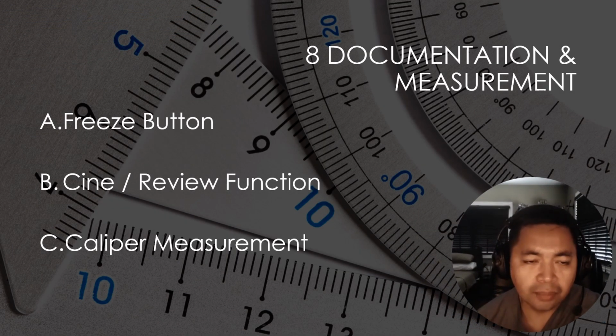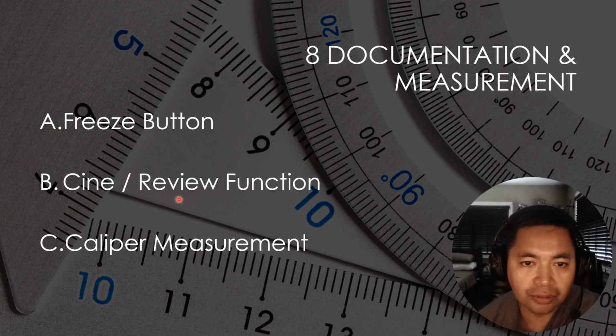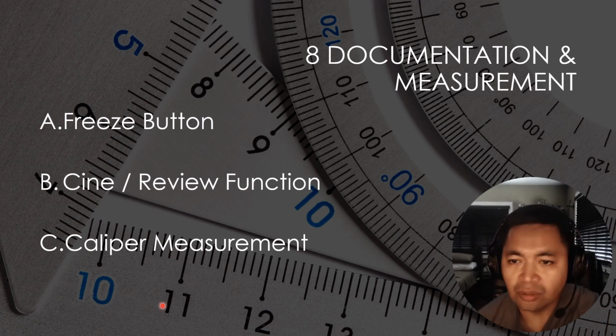So for the last step, step 8, after image optimization, we go to the documentation and measurement step. There are three essential and most commonly used functions in documentation, namely the freeze button, the cine or review function, and the caliper measurement function. And these are available in all ultrasound machines that I know of.